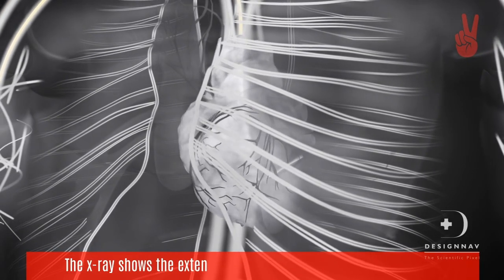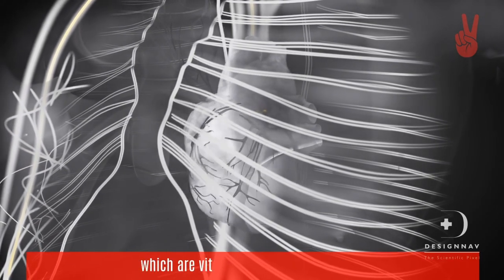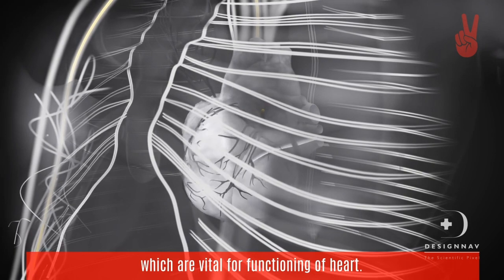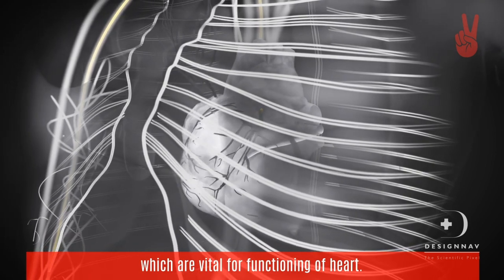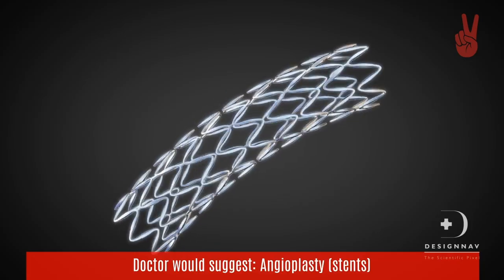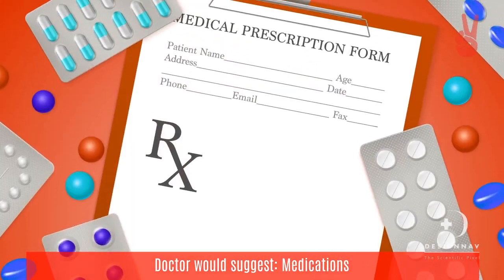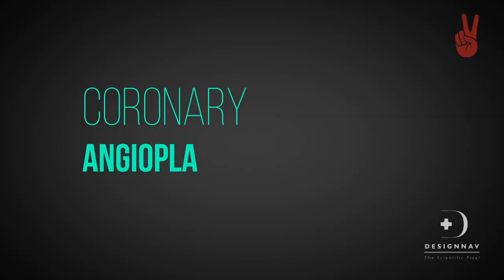This shows the extent and severity of blockage in the arteries, which are vital for functioning of the heart. With this information, your doctor would suggest the treatment options. These may include angioplasty, bypass graft surgery, or medications. Coronary angioplasty.